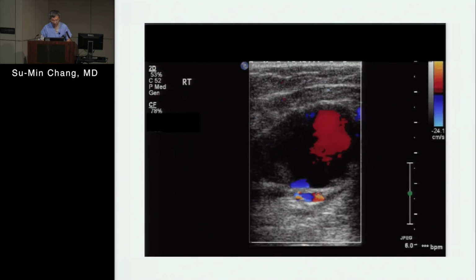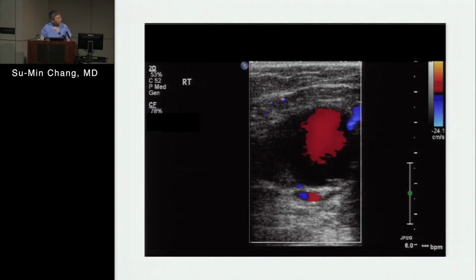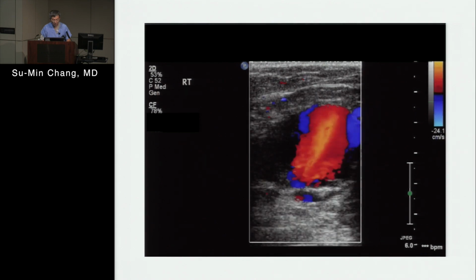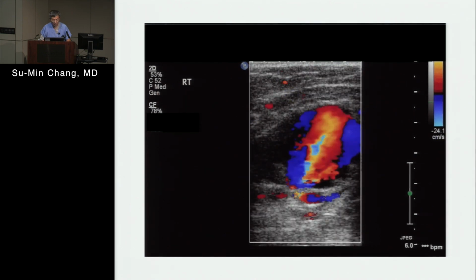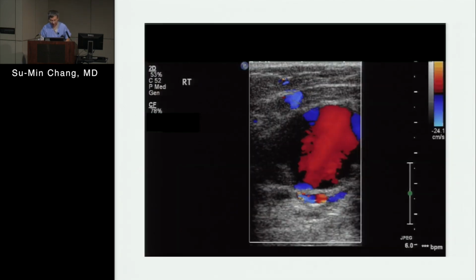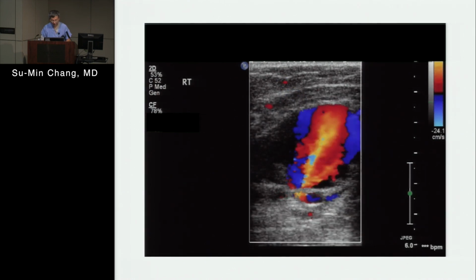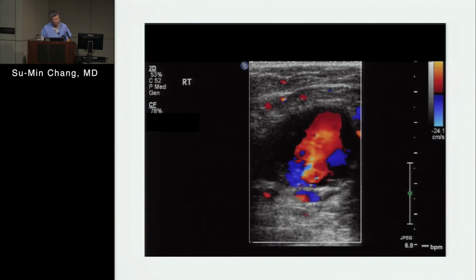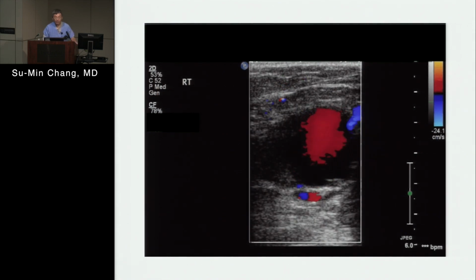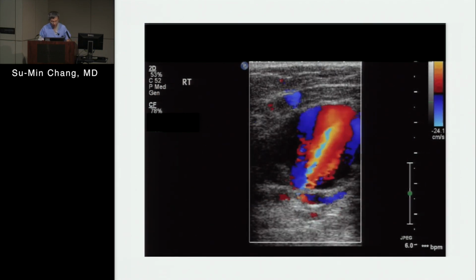So what do you see, Mawash? What's the sign called? There we go, see? You actually can see, yeah, it's actually, I didn't know that until the vascular tech told me. I said, oh, and I go now and Google, it's real. So you can see the blood flow very nicely, the Doppler direction, right?